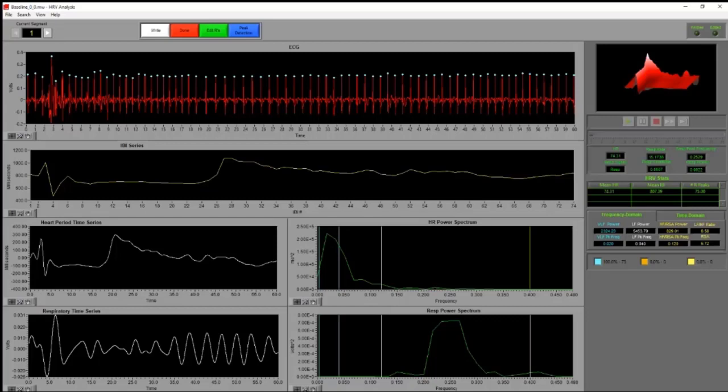And so one of the rules is known as a 5% rule, and it can also be expanded to a 10% rule. And really what that's saying is if we ever had messy data in which we couldn't see the actual signal through the noise, it was too noisy, maybe this one we'll investigate here at around 3 seconds qualifies for that, we're going to estimate where that beat occurred, because what we're trying to do is have a continuous signal. Remember, we don't want to interrupt that without a beat. If one didn't exist, in most cases, we're going to place it there so that the fast Fourier transform has this continuous signal. And that really leads us into the second rule or recommendation, which is 30 seconds.